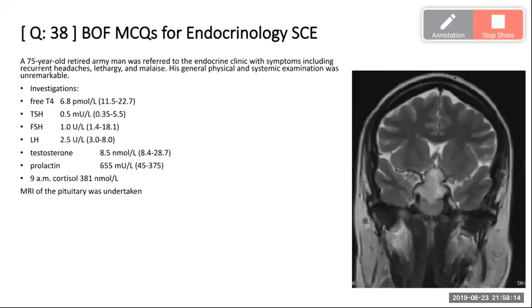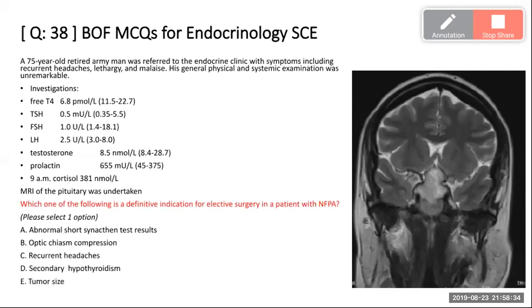We see this. What do you think? A large invasive tumor. Yes, it is an invasive tumor causing hypogonadotropic hypogonadism and hypothyroidism, and it is non-secreting, so it is a non-functioning pituitary tumor.